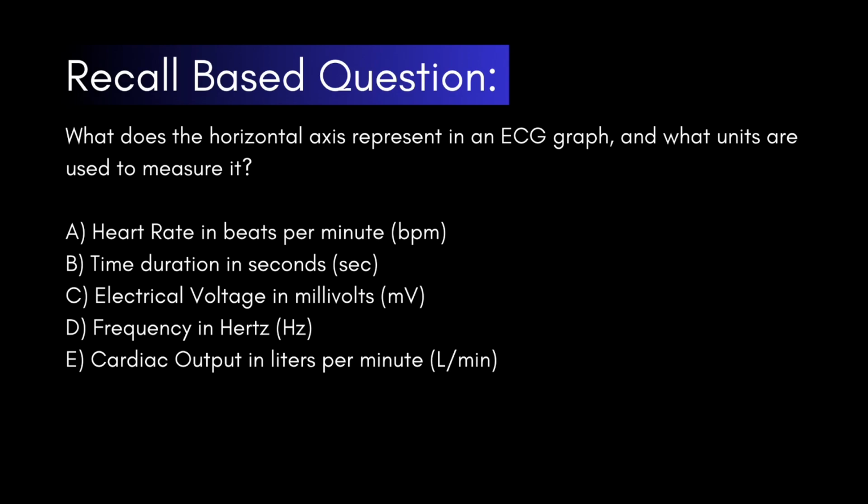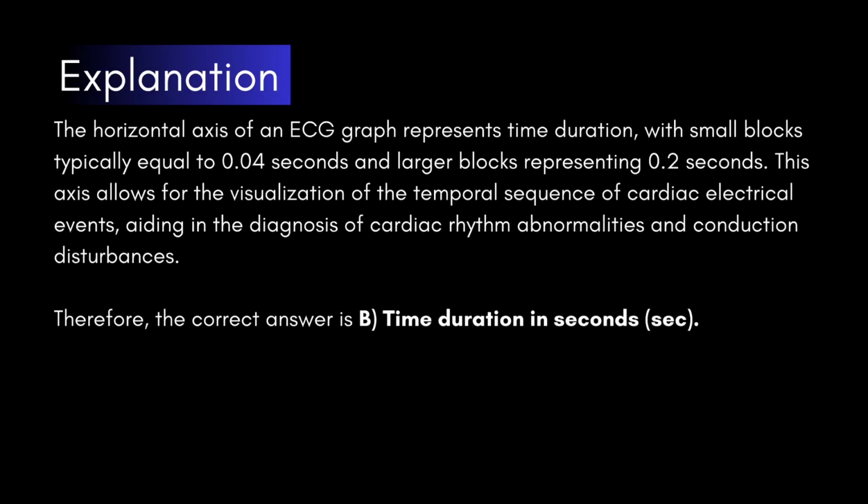All right, I think I gave you guys enough time here. If you need more time, please feel free to pause the video. Otherwise, moving on to see what the correct answer is.